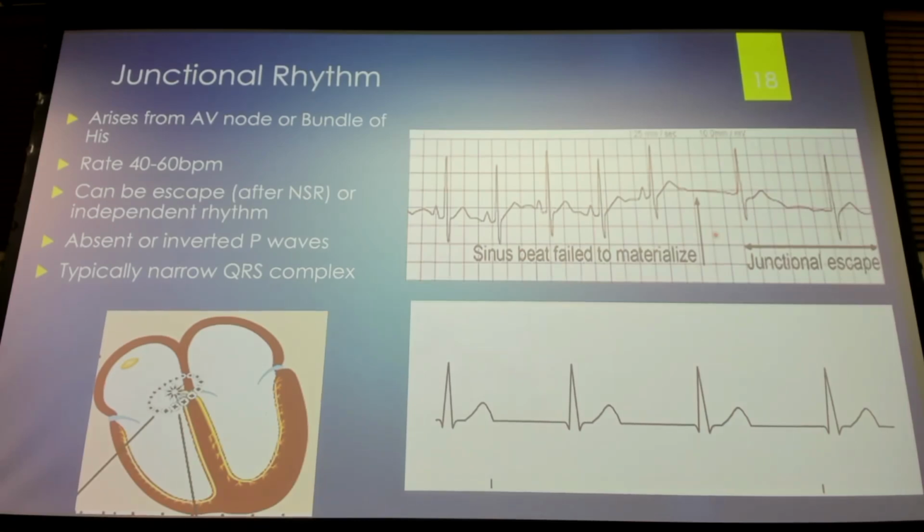Okay, so this is coming from the junction area. Oftentimes with a junctional rhythm, or even a junctional escape beat, or premature junctional contraction, the QRS complex is really, really narrow, so maybe like a box or so. We know that we have a wide complex QRS and a narrow, but this seems to be super narrow, a lot of times associated with those junctionals.